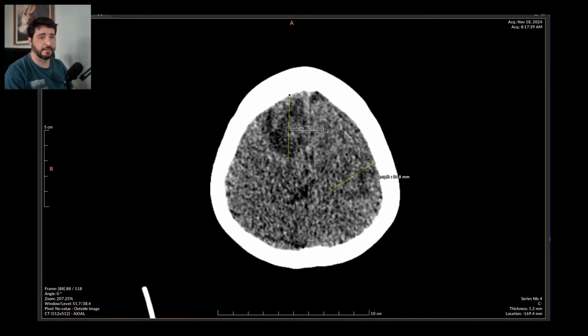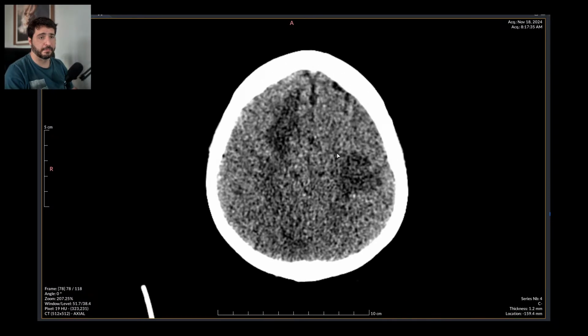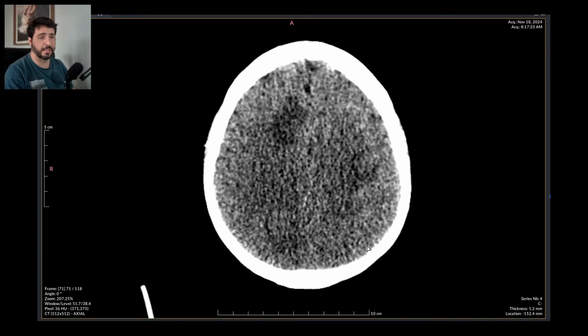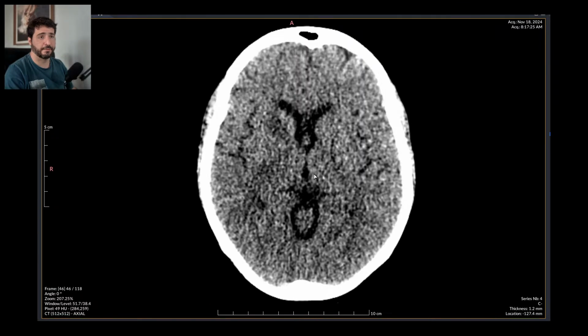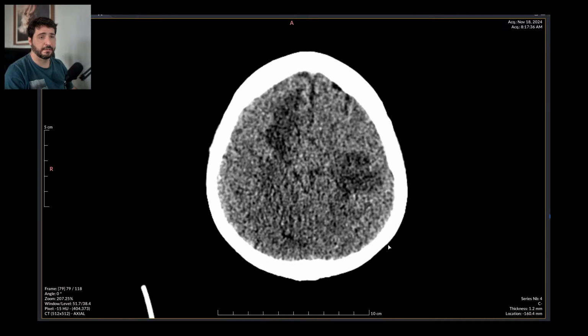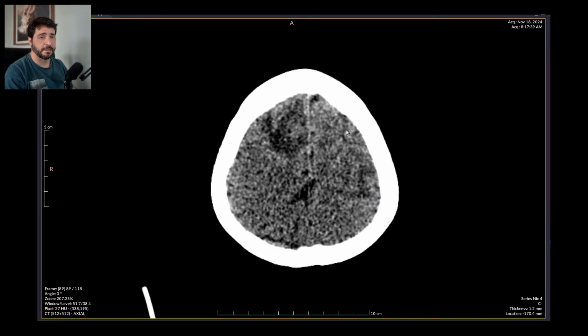Right there, see, this is probably tumor surrounded by edema. There is probably something else here that I can't really tell. And of course, on the nucleocapsular region right there, there is another lesion. This isn't stroke. This can't be stroke really, because this isn't a proper vascular territory.